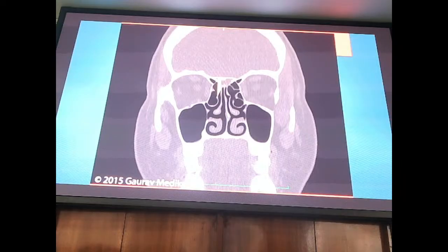I've had a patient where iatrogenic brain injury was done because they did not register this fact. And the second mistake they made was they extended the neck, and that made them go through the skull base into the basifrontal lobe of the brain. And one of the major vessels was also injured. So be very careful to register this fact.